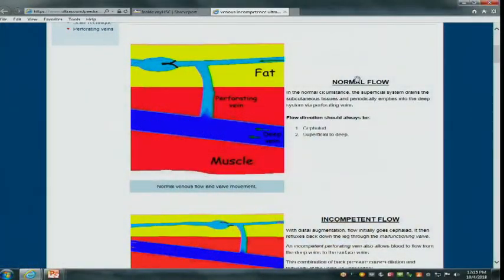Sylvia, when you look at a DVT ultrasound, normally when they do the ultrasound here, what color is the vein? Is it blue or is it red? It's blue. Why? Because the flow is from caudad to craniad, right? What should be the normal color in the great saphenous vein? Blue. Very good, because it's draining blood from the medial malleolus to the calf, to the thigh, and then draining it into the common femoral vein.